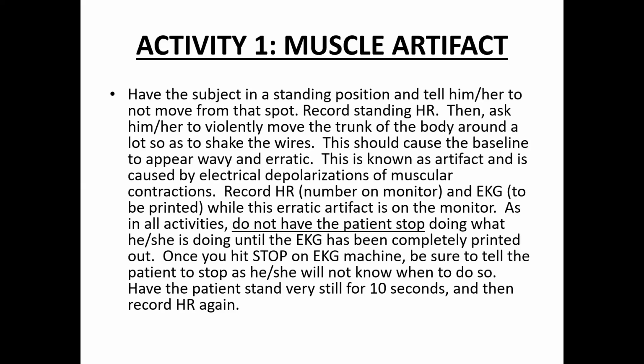Here we go. One of the things you'd see the most when we hook up the EKG to our students, whenever you move a muscle or laugh or talk, you're going to get an artifact. An artifact is something that shows up on the EKG that looks abnormal, and it is, but it's not a pathology. It's just an artifact like skeletal muscle depolarization. So it's skeletal muscle artifact.